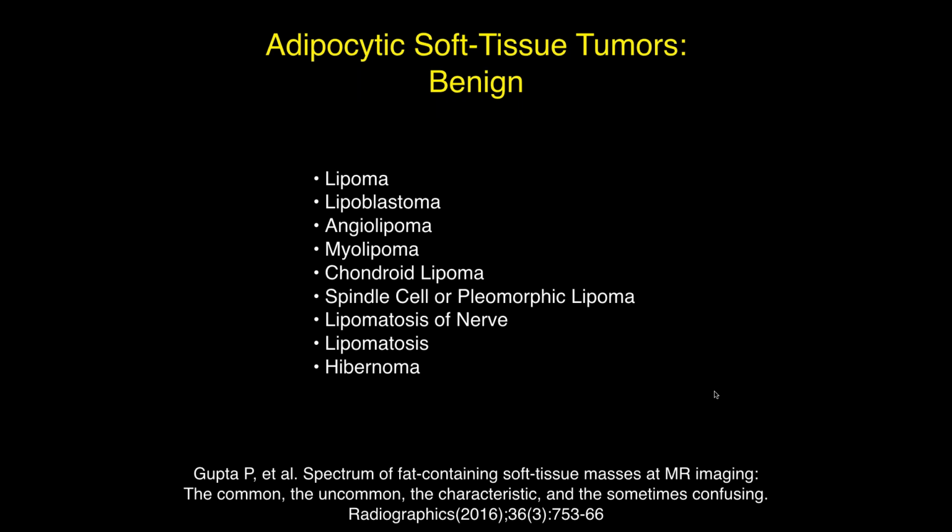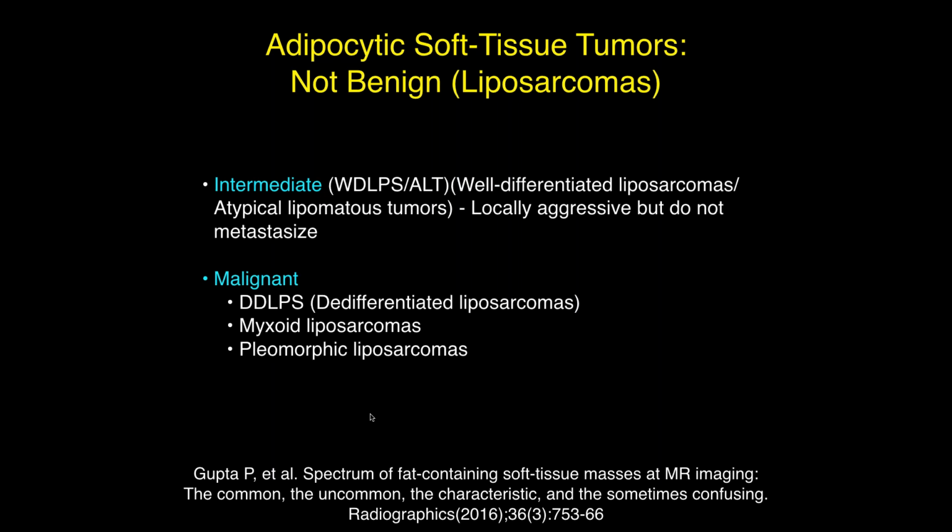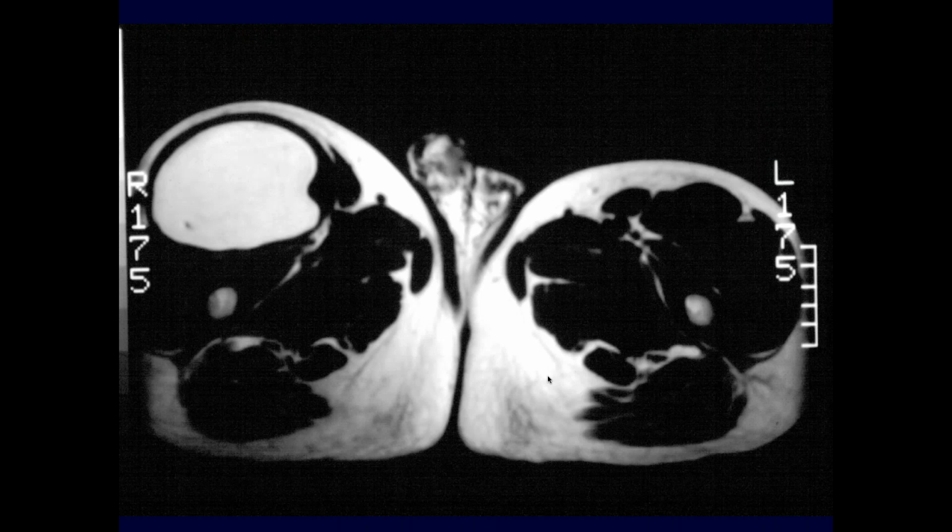Tumors that have fat within them. Okay. And then we kind of already talked about this, but there are a bunch of lesions that can present with fat, both benign and malignant. The sarcomas, you tend to have more inhomogeneous signal intensity. When it's the medium to high grade malignant tumors, they tend not to have MR detectable fat within them. The fat is microscopic in those. You see it under the microscope. So let's look at a few of these.